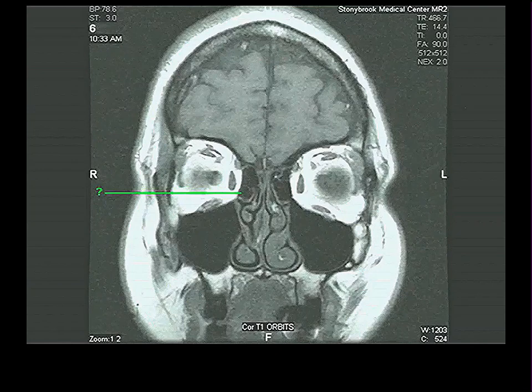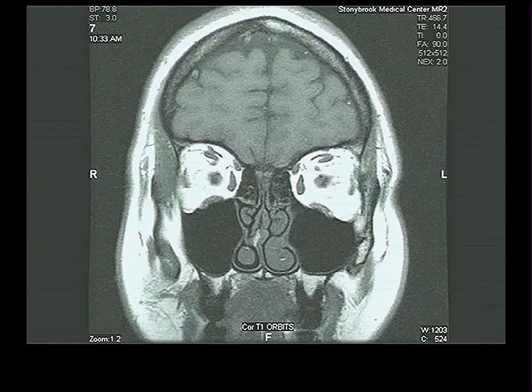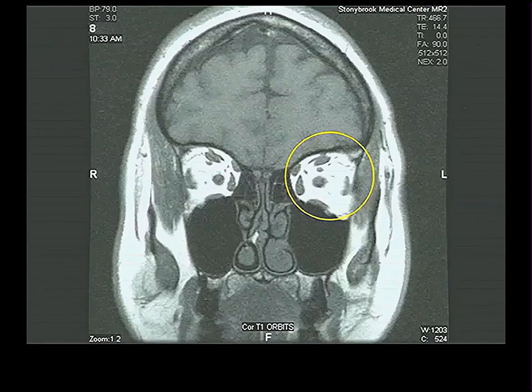All right, that's right. This is the air cell which causes the bulla ethmoidalis. The bulla ethmoidalis is a bulge in the lateral nasal wall under cover of the middle concha, and the reason it's bulging there is because a big air cell is in it, and this is the air cell that's causing the bulla ethmoidalis. Nothing exciting going on here, and now you can see everything in this MRI of the orbit.